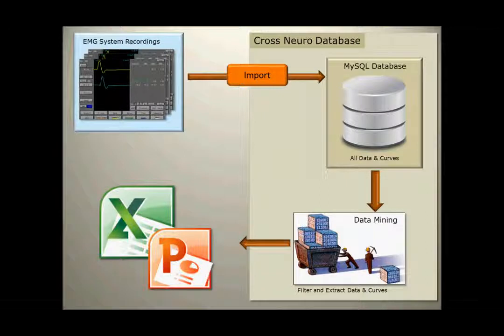This program has an import function that will automatically read all patient data files from your EMG system and place both numerical data as well as recorded curves into a database located in your computer or on a server. You may then search, filter and extract data and curves with the built-in data mining functions and have the results presented in Microsoft Excel and PowerPoint.